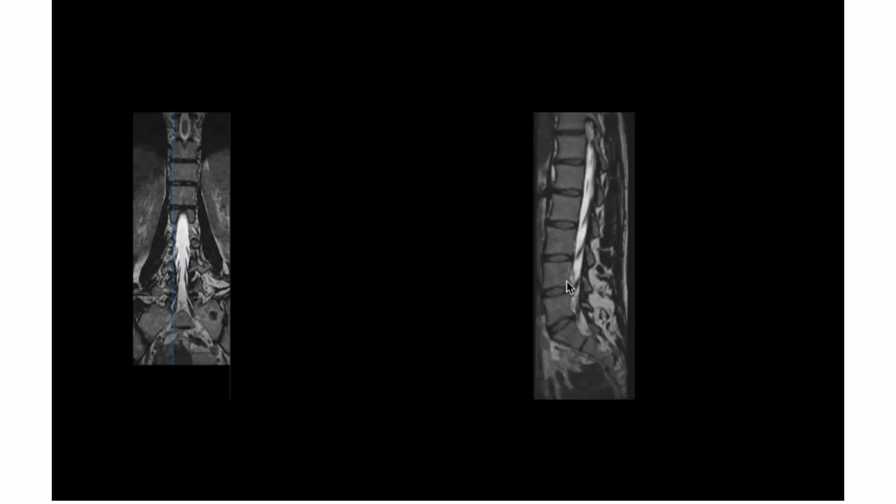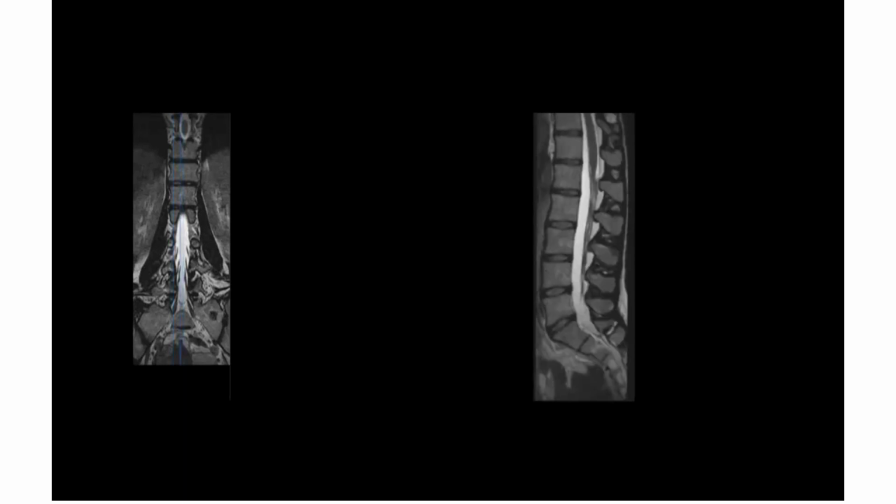Which will be the traversing nerve root. Exiting or the traversing root? No, the traversing root. Traversing nerve root. Okay. If it is a central herniation, it may compress all the roots which are traversing. If it is purely central herniation, your exiting root is free, traversing root is free, but all the bunches of nerves which are traversing from the center may get compressed.